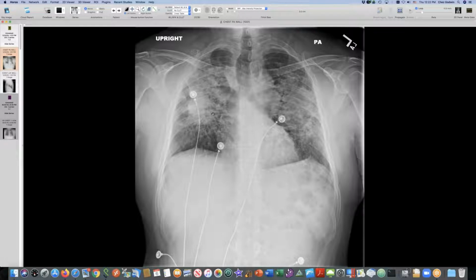Now he has this really dense pattern of progressive massive fibrosis. Notice the tracheal buckling here from the upper lobe volume loss, the greater juxtaphrenic peak here, which is caused by traction on the inferior accessory fissure, as we will see on CT, not traction on the inferior pulmonary ligament, which, as everyone knows, is located along the esophagus and never would generate a line out here. So this is rapidly progressive silicosis from this countertop fabrication.